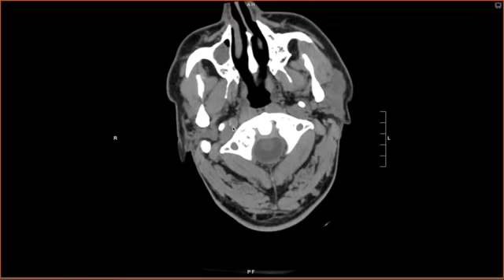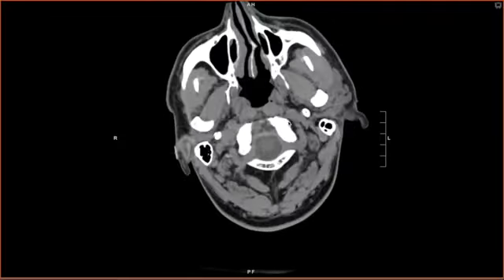As we know, acute clot or acute blood is bright. This is a case of a dissection. When you have an acute dissection, you get acute mural hematoma or an intramural hematoma. And this is the most subtle sign of an internal carotid artery dissection. A CTA was done thereafter and confirmed that this was in fact a dissection. An interesting case with no other findings except for this.